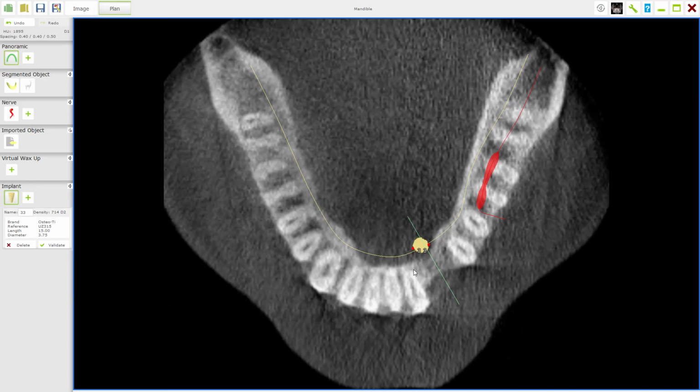Once you lose the tooth, of course, the ridge drops in, and this is why you end up positioning the implant too far lingually, because from a restorative point of view, the crowns need to be out here in the labial. So our root is really too far. If we think of the implant as being a root, our root is too lingual, isn't it? So we would ideally like to have our implant head around about here to really get a crown that fits in line with the labial surfaces of the other crowns. But we can't get that because of this lack of bone.